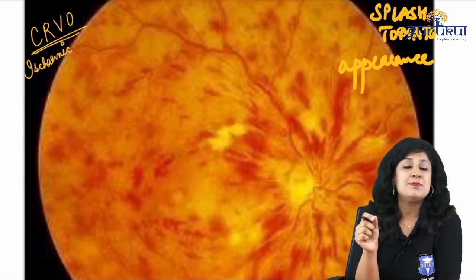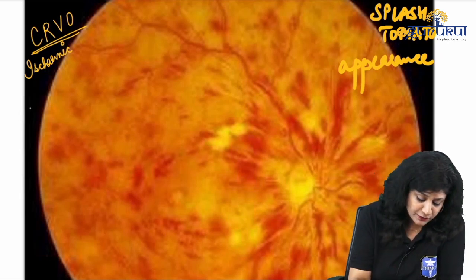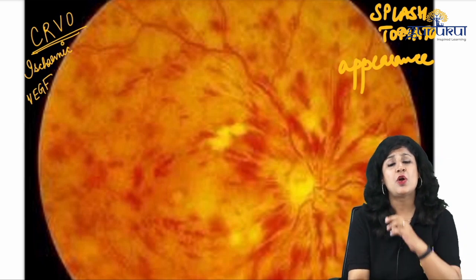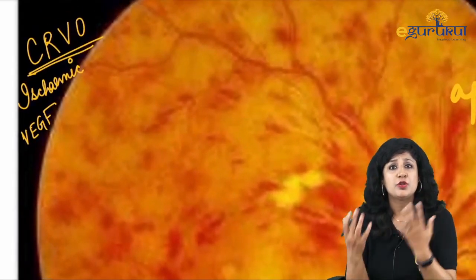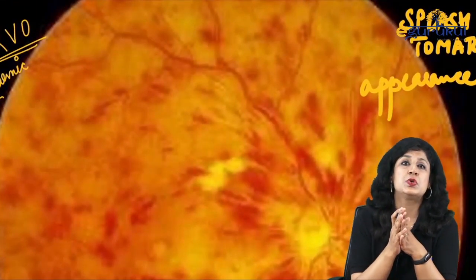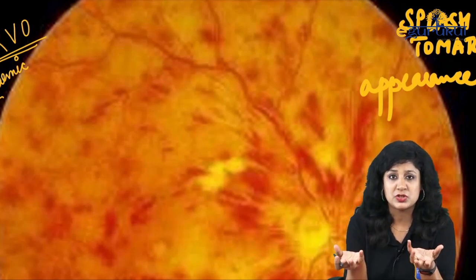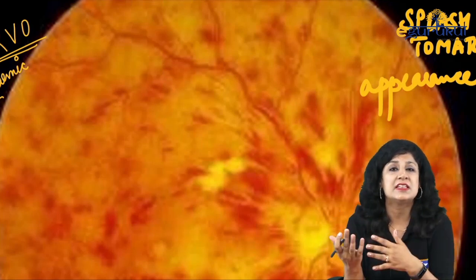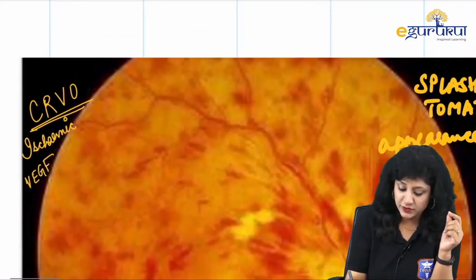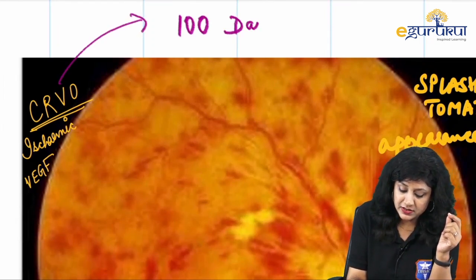But in 25% of the cases, we have ischemia, we have a lot of VEGF, and due to the release of VEGF, we have a lot of neovascularization, and a lot of neovascularization means many hemorrhages, which gives you the typical splash tomato appearance. So you should be able to differentiate between CRAO and CRVO, and it is this ischemic variety of CRVO which is responsible for giving typical 100-day glaucoma.